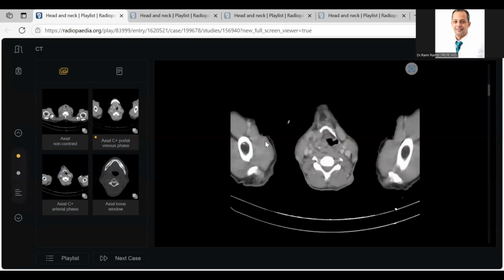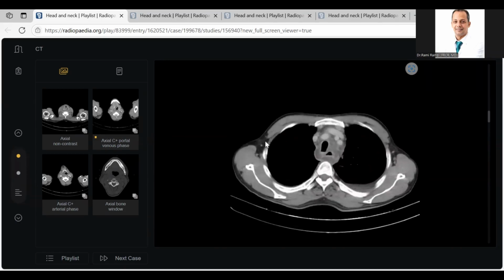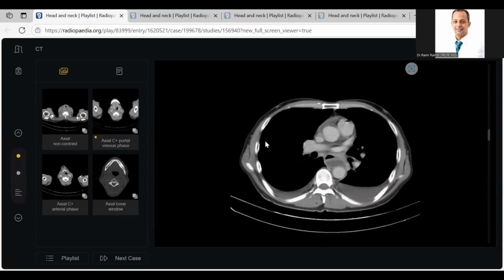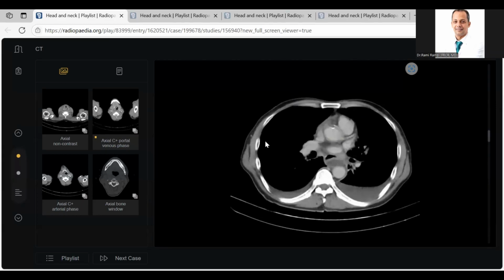In this contrast enhanced imaging of the same patient, the thickening shows a collection with enhancing walls along the parapharyngeal and side walls, extending into the mediastinum and tracking down into the posterior mediastinum. What's your differential? An abscess. This is likely a post-infective abscess with infection in the parapharyngeal space, extending through into the mediastinum.